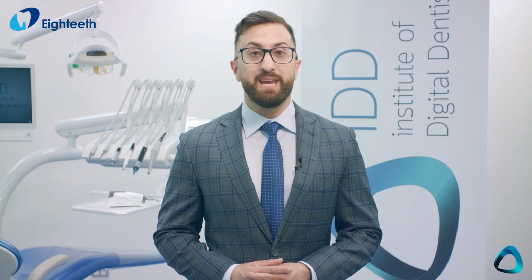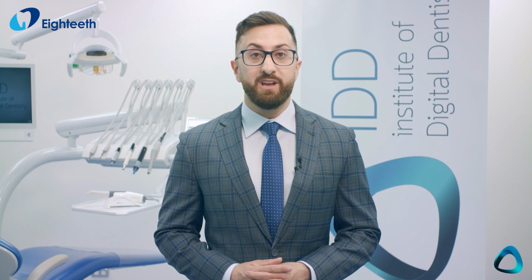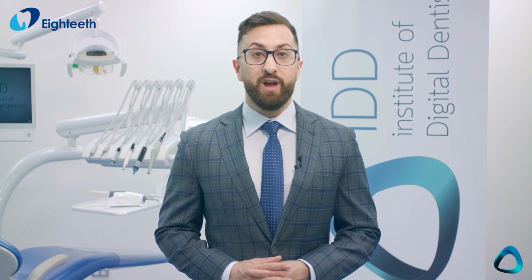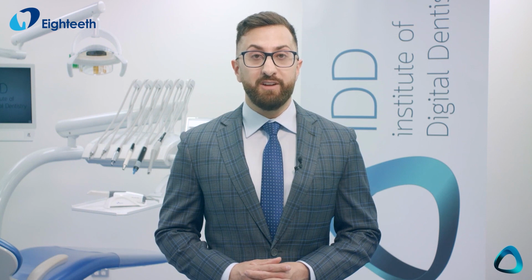Chairside restorations can be a game changer for your crown and bridge work. You can save literally thousands of dollars each week in lab bills and be able to provide your patients with single visit ceramic restorations. I'm going to show you how you can use the Helios 600 scanner and ExoCAD Chairside CAD to fabricate chairside restorations in-house for better patient experiences.